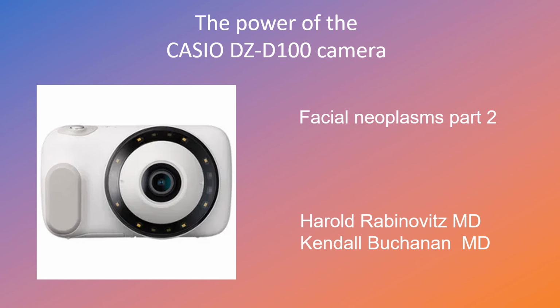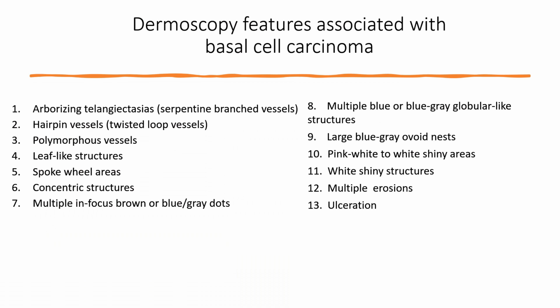So today we'll be talking about facial neoplasms part 2. These are all the dermoscopy features associated with basal cell carcinoma.